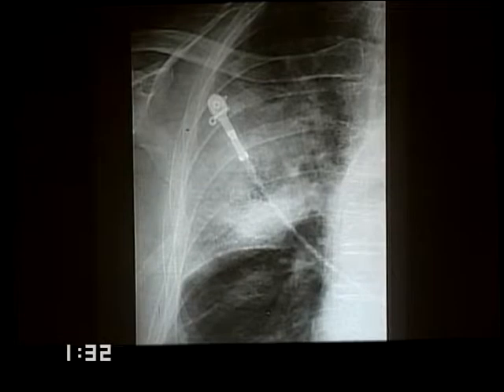Using the retrospectoscope very carefully focused, one notes there is a vague central inhomogeneity. On portable X-rays, the air fluid levels will not be visible because these patients are never upright. And in addition, cavitation will only be visible to you when the cavity communicates with the bronchus, permitting air to enter. Classic upper zone airspace opacity with a central cavity. It should be tuberculosis. It should be reported as tuberculosis.